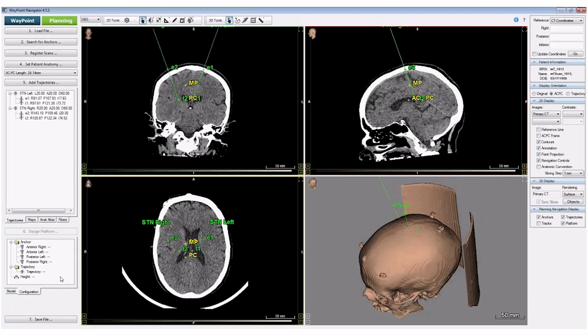And once that's good to go, you can pack your file on top of the old pack, or you can save it in a new one and upload your production file to FHC, and you'll be good to go. Since I've already covered all of those other steps, I'm not going to go over them again. If you'd like to review how to do a plan, you can refer back to all of the other previous videos.